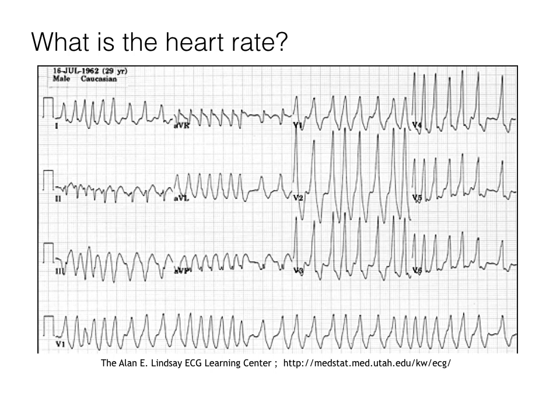What is the rate in this? Here we will count the number of times the QRS complex is present in this strip. It is 1, 2, 3, 4, 5, 6, 7, 8, 9... 33. So it comes out to be 33 times 6, which is equal to 198 beats per minute.